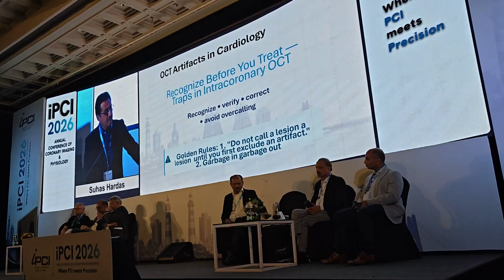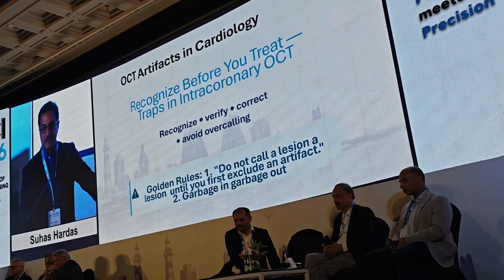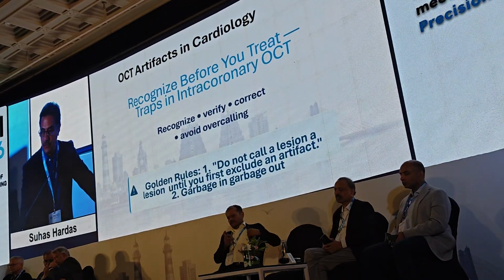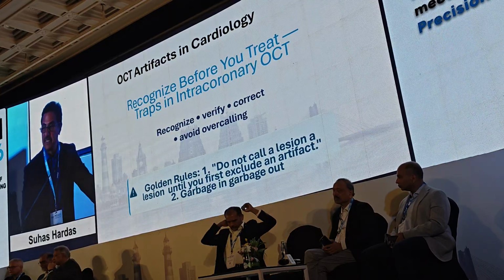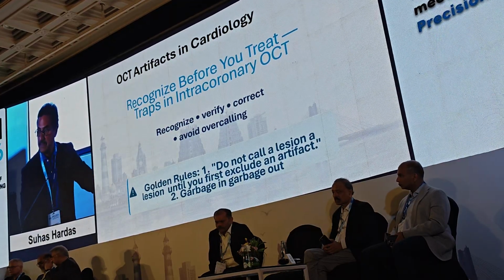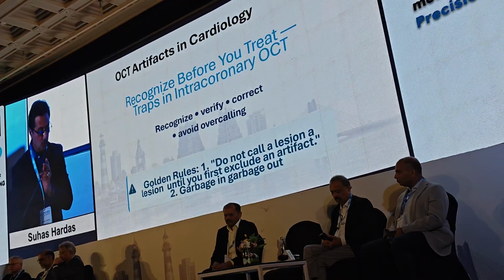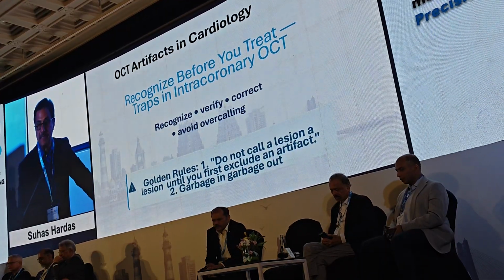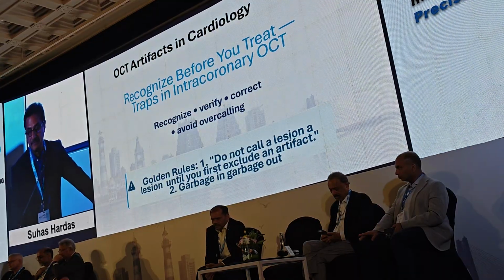To verify if you see an artifact, because miscalculation will lead to inappropriate selection of therapies. And sometimes it is better to correct, take a second run and get a better picture. Because the golden rule says that do not call a lesion until you first exclude an artifact.